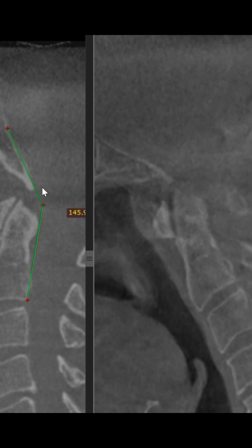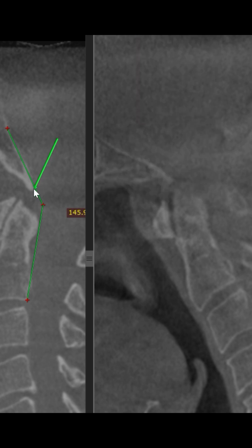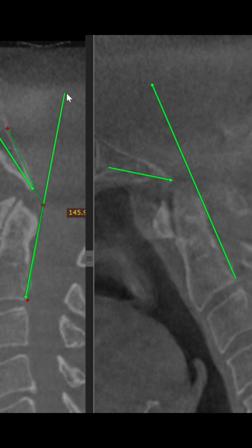Now, automatically, you can see something very interesting here I want to point out is look at the tip of the clivus, and then the tip of the clivus here. Now let's just do a posterior line, and I'm just going to do another posterior line. Actually, it's right here. That's about the same distance. Okay. Now wait until we see the flexion. You'll see the difference.